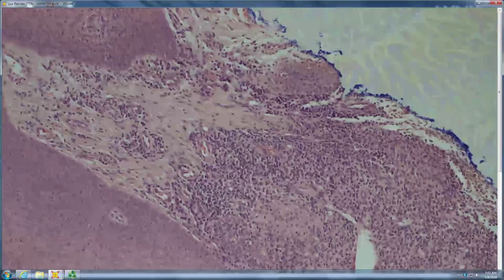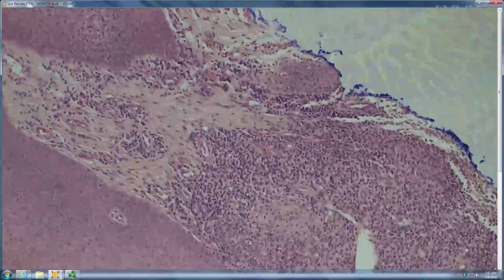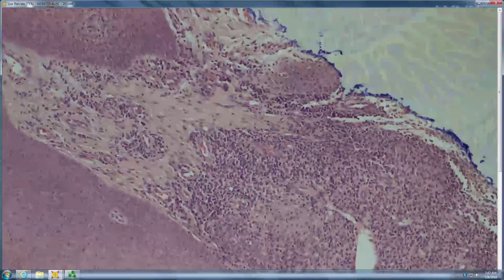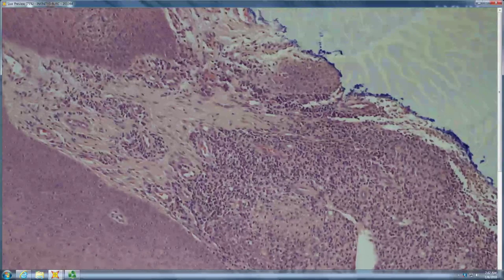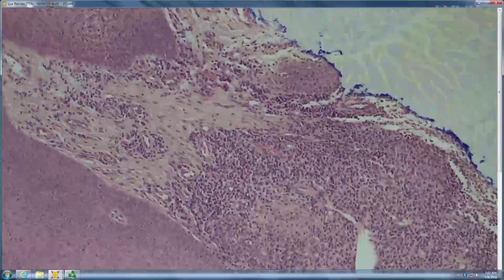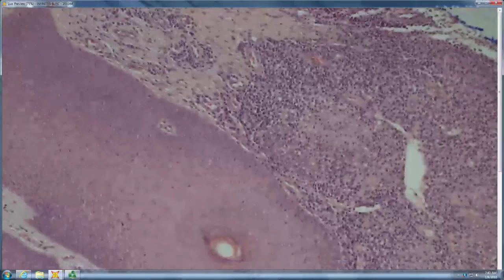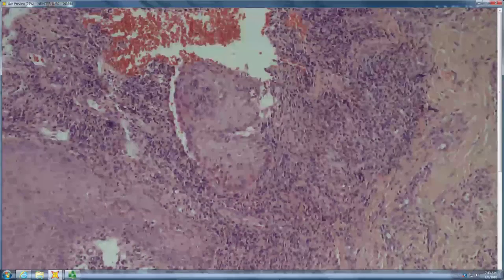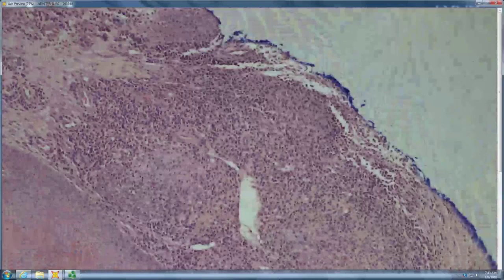So early, with bad microscopes, they started to differentiate how sarcoid looked different from tuberculosis. Sarcoid, the granulomas tended to be naked, no lymphs. Tuberculosis, lots of round cells, many of which are actually monocytes mixed with lymphocytes. They're the cells that become the granuloma eventually. And so basically you've got a granulomatous dermatitis here, right? So what's your differential for a granulomatous dermatitis?